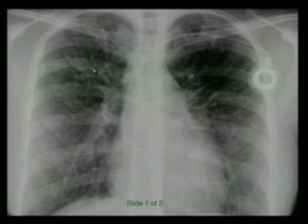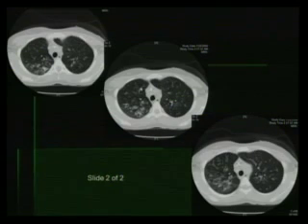Here is another patient with cystic fibrosis that often have a portacath. In CT, you know that the artery is the little white dot, and the bronchus is the ring with the black in the center of it. This is the signet ring sign, I'm drawing a blank, it looks like a pearl ring. You have your ring and the little pearl on it. That's bronchiectasis. The bronchi should be the same size and not bigger than the adjacent pulmonary artery. So this is bronchiectasis here, cystic bronchiectasis.